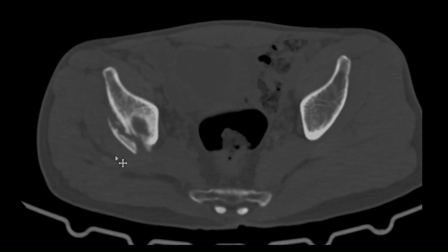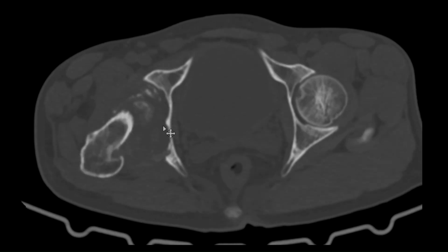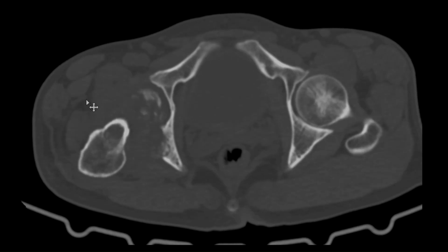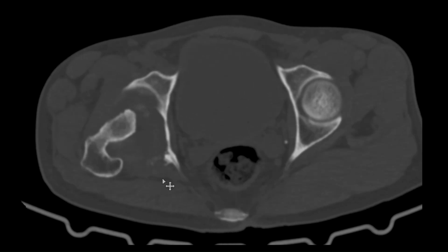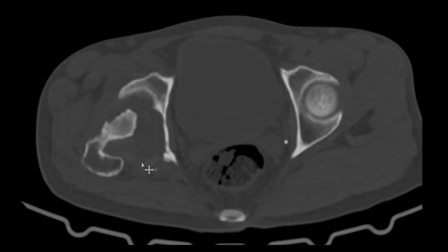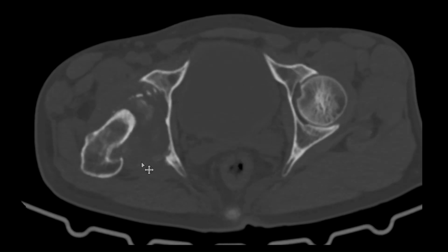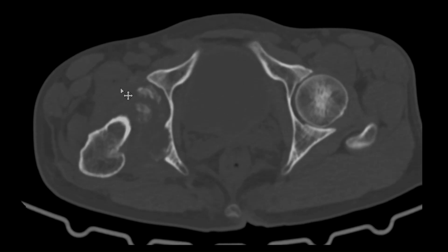So these are the fractures which might have occurred earlier, but now we are seeing a gross effusion. So there is a gross right-sided hip joint effusion, and we see that the femoral head is not seen anywhere. And also there are erosions and there is dissolution of the prior bone. One more thing that we see is the capacious right-sided acetabulum.